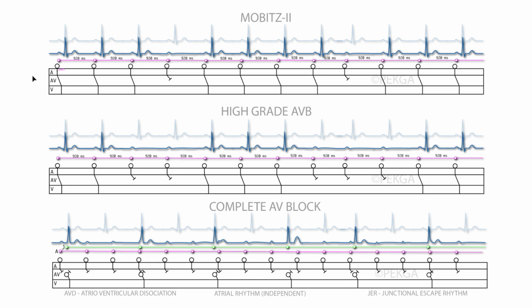This is something that's known as a ladder diagram, and if you want to get real good at reading ECGs, this is something that you will have to get introduced to at some point. Not to get into it, I'm just going to use it to illustrate a point here. So when we're talking about typical Mobitz-II that you will see out here, this is what I was talking about. See how, over here, faded in the background, that would be your normal sinus or expected established rhythm going, right?